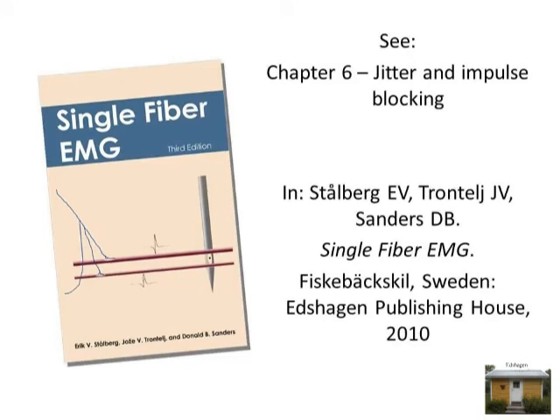Details about jitter calculations can be found in Chapter 6 of the Single Fiber EMG book.